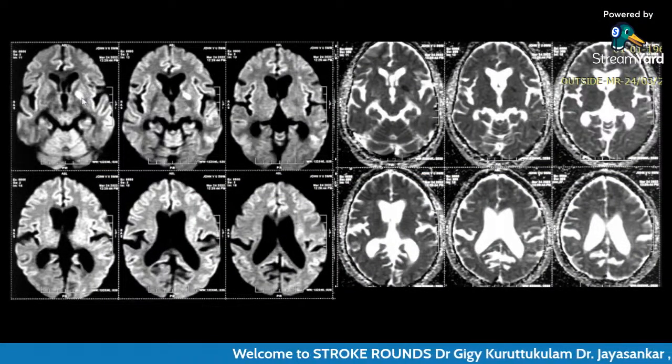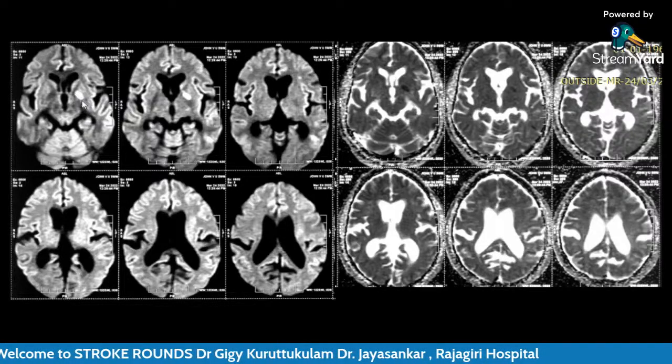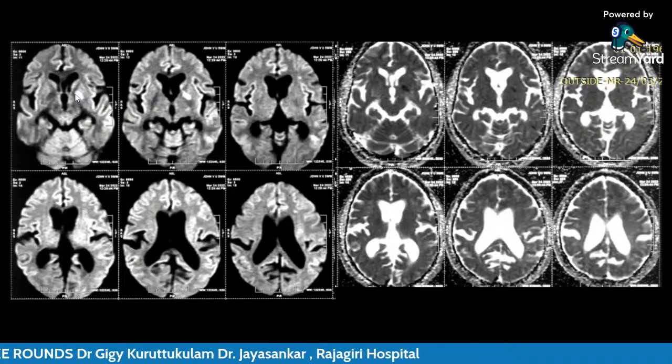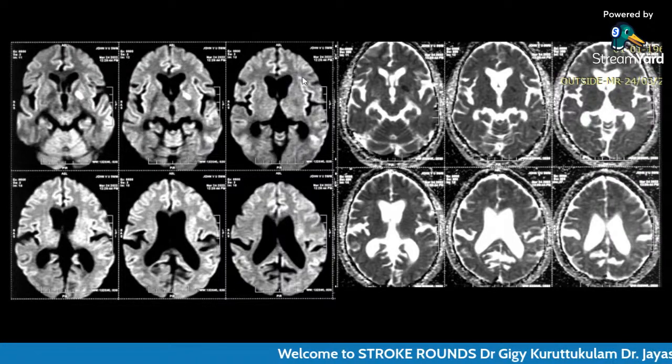What does the MRI show? MRI showed acute infarct with diffusion restriction in the anterior internal capsule with basal ganglia on the left side, along with cortical watershed area diffusion restriction, suggestive of an embolic component in the anterior and posterior part.